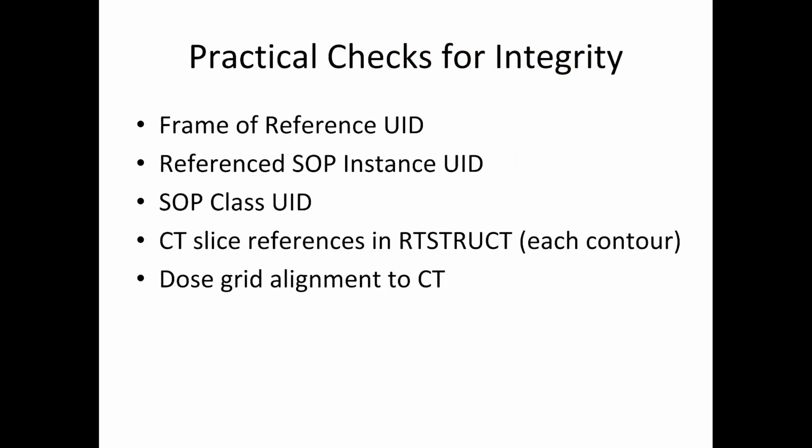So what can you do? Always validate these three things: frame of reference UID across all files, SOP instance UIDs between referencing and referenced objects, and that RTStruct references actual CT slices in each structure set ROI sequence. Also check that the dose grid overlays correctly on the CT.